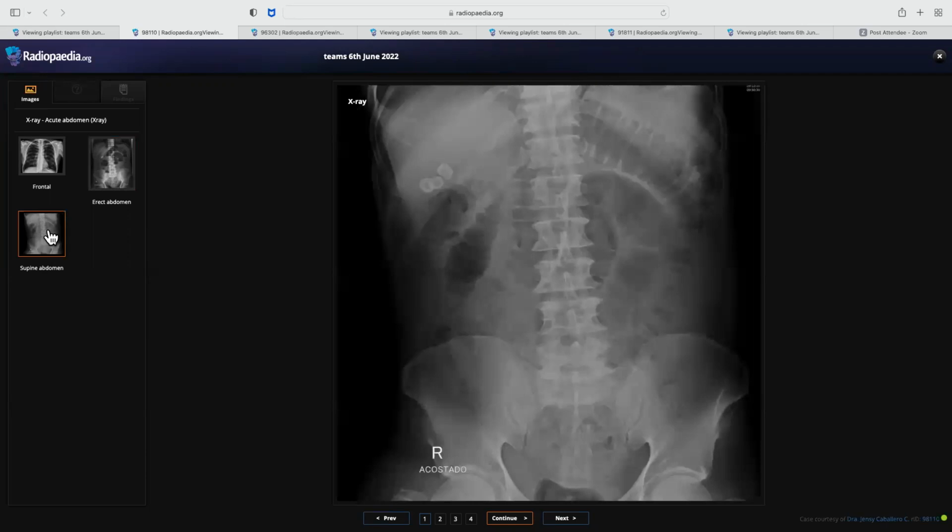Now I'm looking for any other abnormality within the pelvic region. So I'm assuming this is an intestinal obstruction, most probably of the small bowel, keeping in view the central position of the bowel without overt evidence of pneumoperitoneum. In addition, there are incidentally seen a few faceted lamellated gallbladder stones.